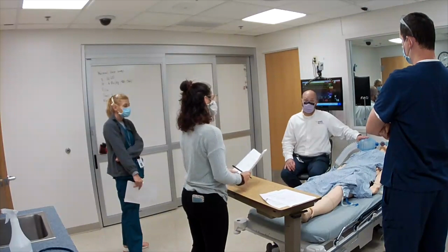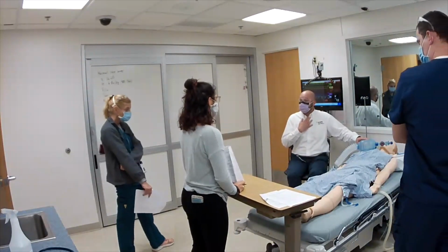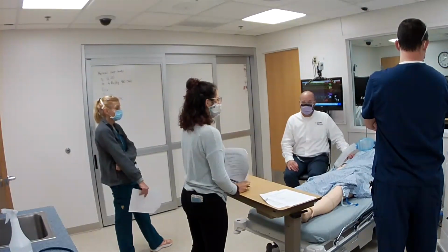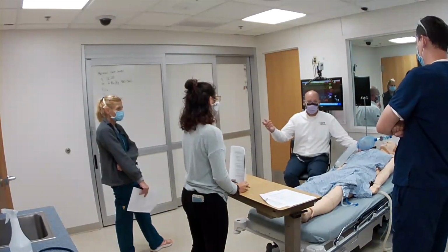What's the caveat? Leaks, noise. Well, so you got some leak problems if you can't get a good mask seal. What else does the patient have to have when you're on CPAP? They can't puke in the hole. Yeah, they'll fill up that mask in a hurry, won't they?